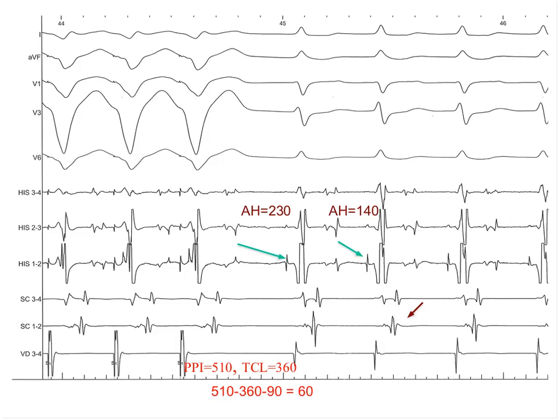As you can tell now, when we see all the tracings, the activation was eccentric. The tachycardia involves a left-sided accessory pathway, you can easily tell now. But if you didn't have a coronary sinus catheter as in the previous tracing, then this maneuver could have been of great help. Also, if you measure the VA interval during pacing here as compared to the VA interval during tachycardia, you get about the same result, a 60 millisecond difference, which goes very much in favor of accessory pathway-mediated tachycardia.